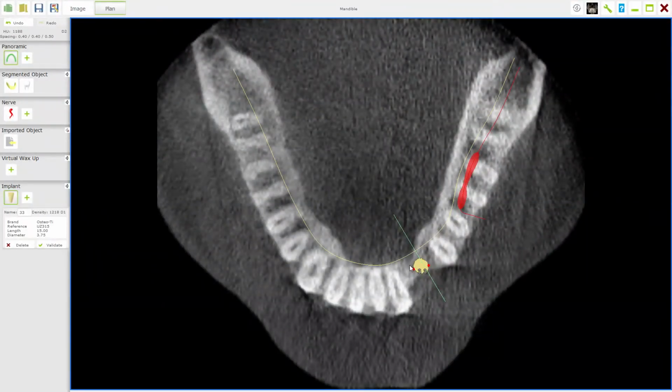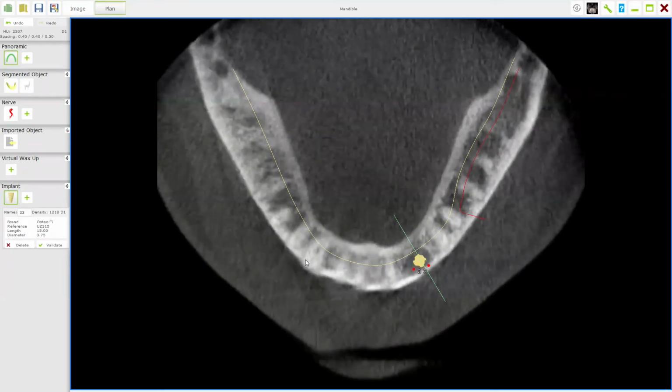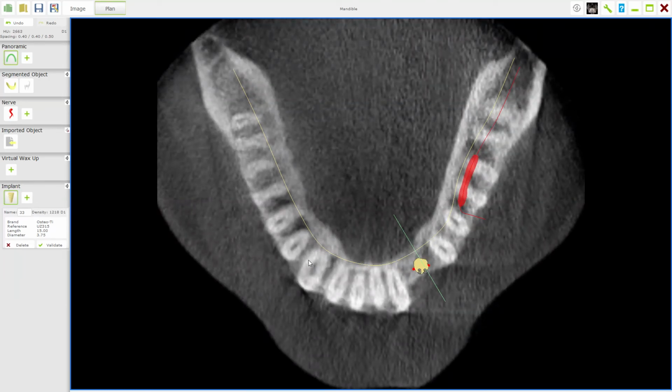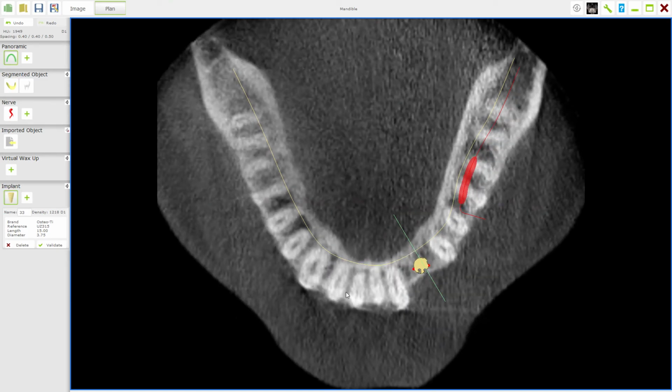So we can get to see, there's the bone on the lingual, there's the bone on the labial. Again, very little bone. The other thing I'm looking at also is the space between these teeth. Now, if you look here, we go to the crown here. This is the crown around these teeth. Here you can see this, and there's bone here. This is the canine on the other side. Now, to me, this space is quite large for a canine. A canine would be about 8 to 9 millimeters mesiodistal width.